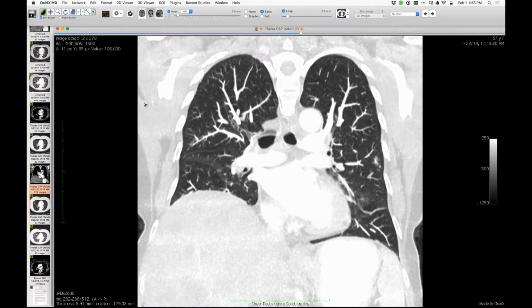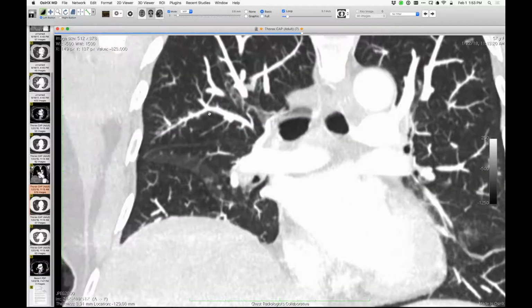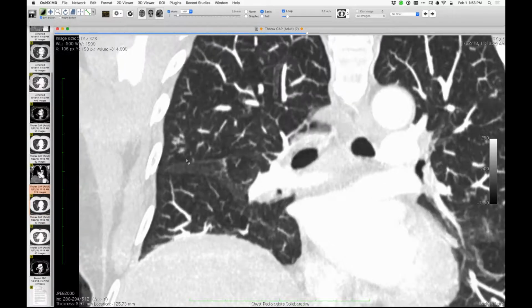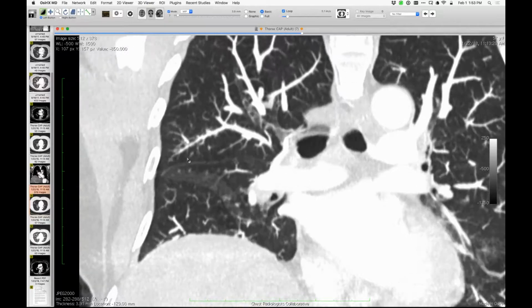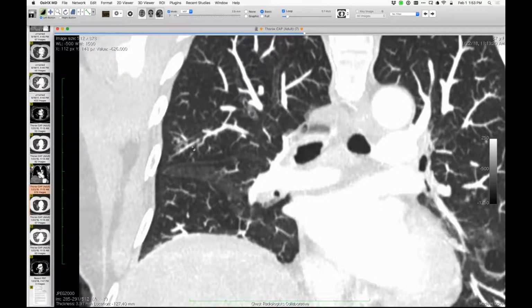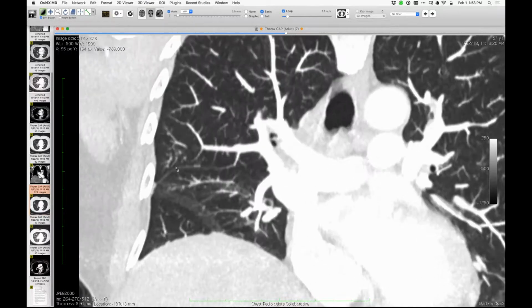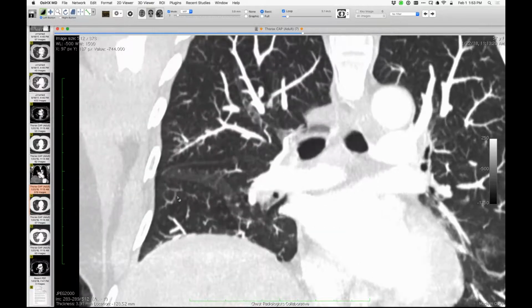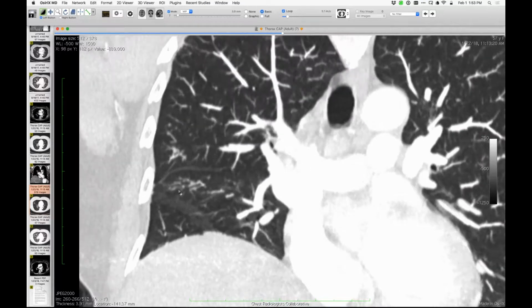Sometimes things are easier to recognize than describe. When I see this pattern, I think maybe knobby is a nice word to use for these vessels, right? If they're not frankly tree and bud type, they're kind of knobby vessels. They're just not smooth, and they're distended. But it's a fairly distinctive appearance in my experience. Not that we see that often, but I think when you see this, looking in this region, it's very distinctive, I think. Let's call it Howard's knobs.